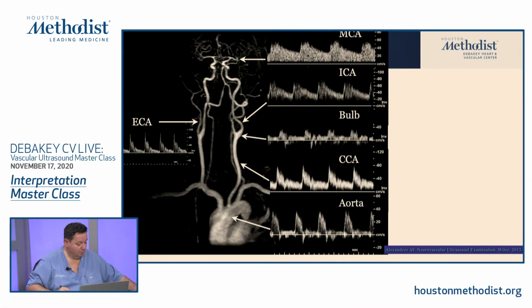Without any further ado, I would like to show you our first case, which is a 66-year-old lady with right-sided weakness, facial droop, aphasia, and a left MCA infarct within a month. We performed this carotid ultrasound this weekend. So these are really fresh cases. We are not digging out really old cases, but wanted to show you what we've done this weekend.